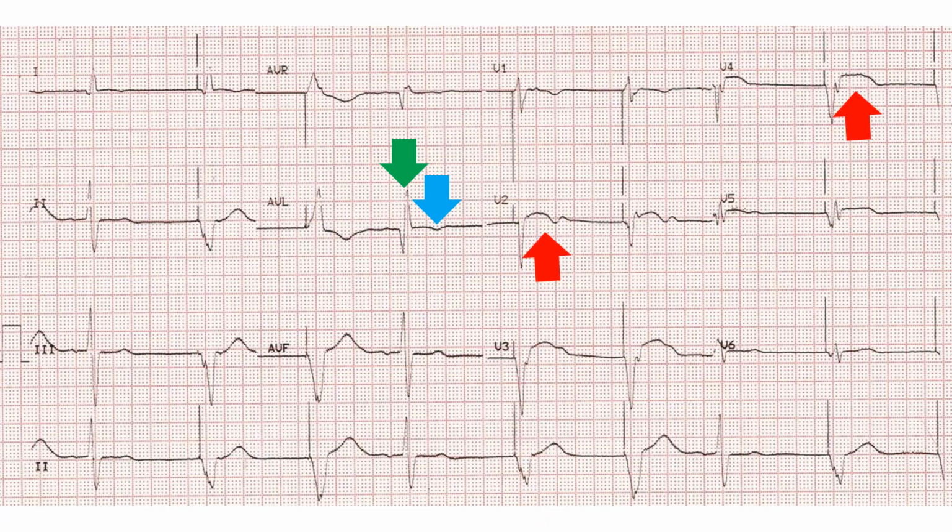Coved ST segment elevation along with T inversion is seen in paced beats in anterolateral leads, suggesting anterior wall myocardial infarction. The QRS complex of sinus beats show QRS width of 120 milliseconds and left axis deviation suggestive of left anterior hemiblock, LAHB. QRS width of paced beats is 200 milliseconds, indicating significant myocardial damage.